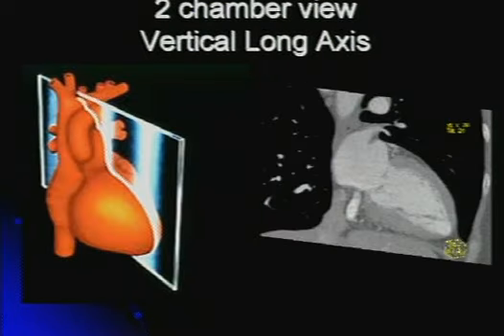Moving on to the vertical long axis view, otherwise known as the two-chamber view, we have visualization of the left ventricular chamber, the left atrial chamber, and some vascular structures, including the pulmonary arteries and coronary sinus. The ventricular walls here are the anterior wall, the inferior wall, and the apex. And again, we see the left-sided atrioventricular mitral valve, and the pericardium again, which surrounds the heart.